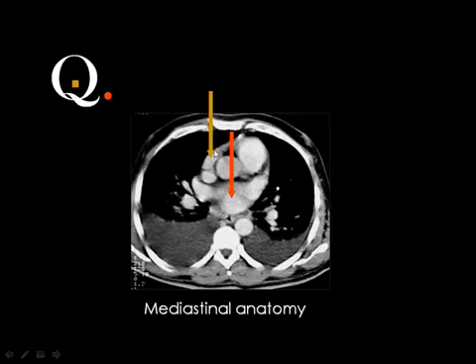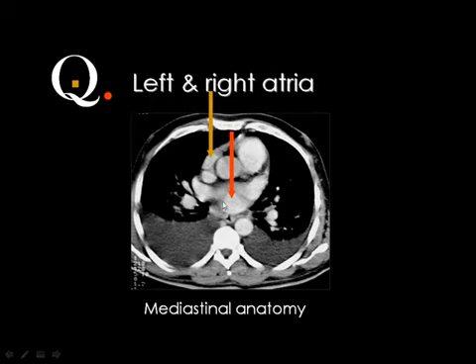Do you remember this chamber? Right atrium. Very good. And this chamber? No, the right atrium is adjacent to the right ventricle here. This atrium is adjacent to the other atrium, and this is the left atrium, okay? This is the left atrium, and this is the right atrium. This is the root of the aorta, and this is the pulmonary artery entering the right ventricle.